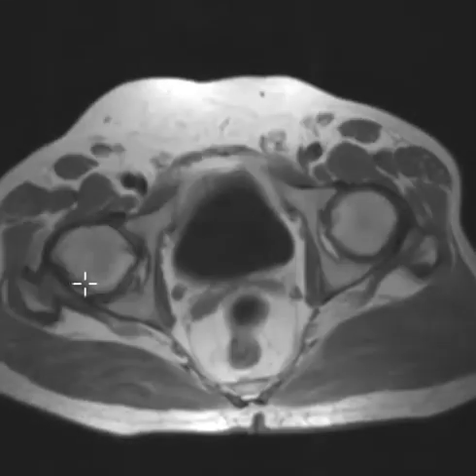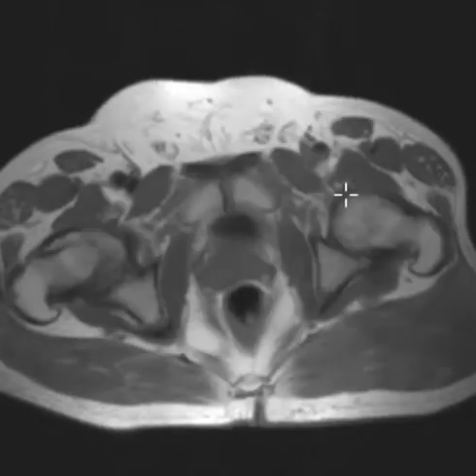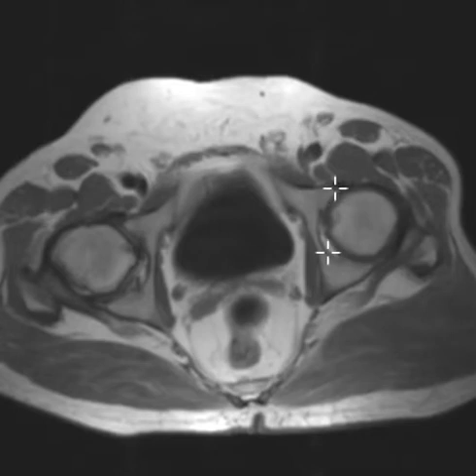Now we're up into the hip joint. We see the right femoral head and the left femoral head, and you can see the difference. This is a nice rounded femoral head, and you can imagine the cup it rotates in here. This is called the acetabulum. The cup is very round, the ball is very round, so the ball and socket are both the same contour. Rotates freely, but over here you see the bony protuberance.